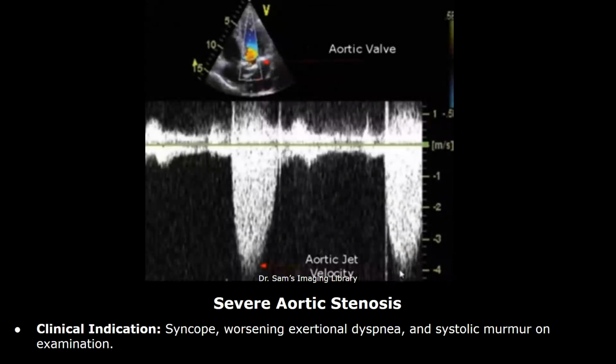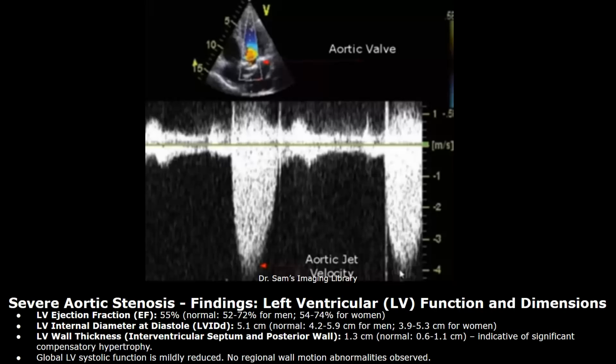This is a report for severe aortic stenosis. The clinical indications are syncope, worsening exertional dyspnea, and systolic murmur on examination. The ejection fraction is 55%. The LV internal diameter at diastole is 5.1 centimeters.